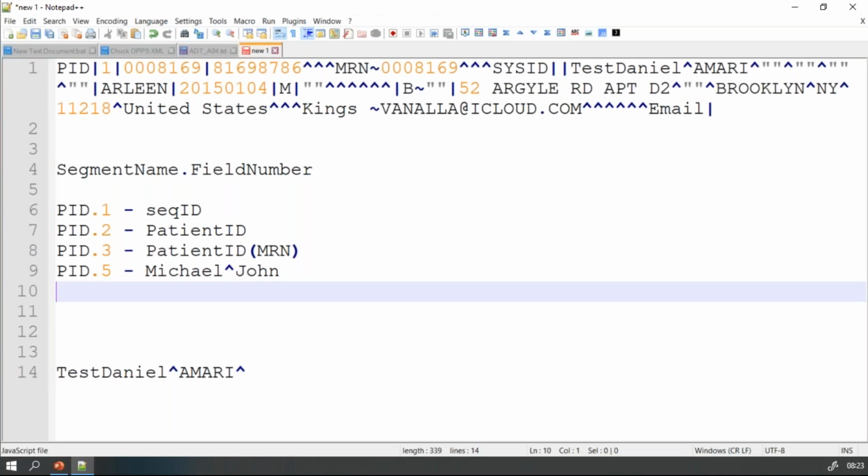Sure. In terms of XML, you will be using an XSD schema, right? For validation purposes, we are going to build all of those validations for HL7 in the Mirth Connect transformation engine. The reason is that specifications are not standard across all the hospitals.